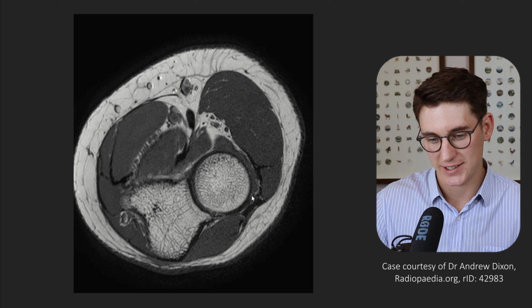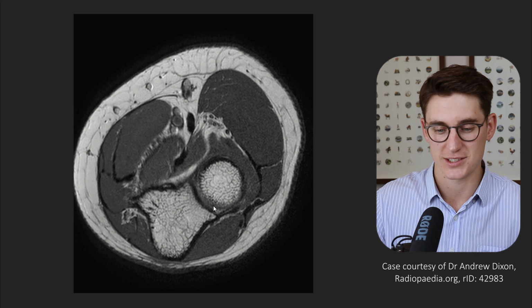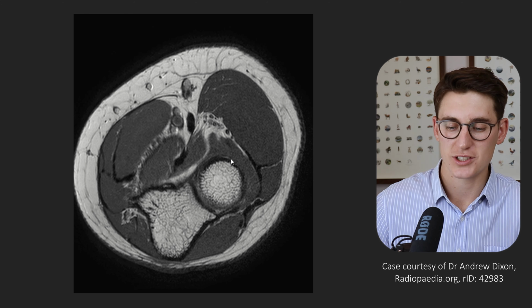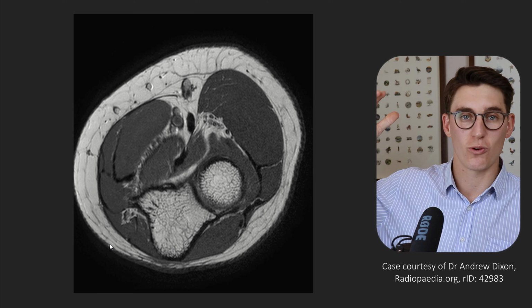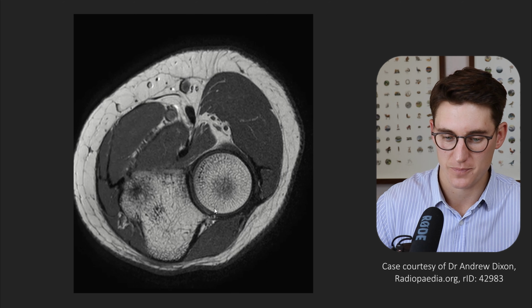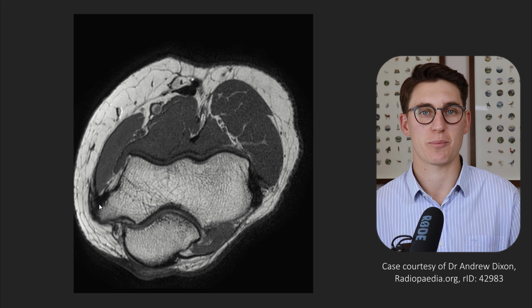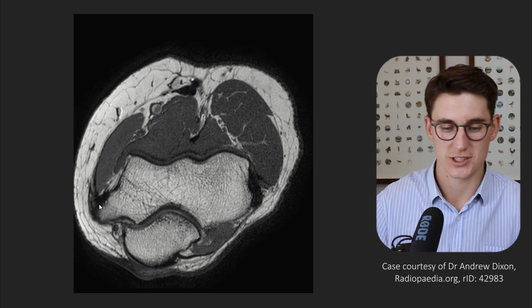You can see how that gives us a posterior lateral stability here. If we disrupt this ligament here, our radius can dislocate posteriorly there. So on this lateral side, we've got our lateral ulnar collateral ligament, we've got our radial collateral ligament, and we've got our annular ligament. On the medial side, we've got our ulnar collateral ligament that separates into 3 separate sections, our anterior bundle, posterior bundle, and that transverse section.